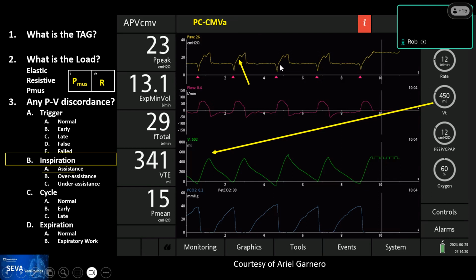So if you have a very short pressure rise, the pressure will rise immediately right up, even if there's an inspiratory effort. So the pressure rise is probably set to make that slow. And why would you do that? For this kind of patient, I probably wouldn't. Then the other thing is we see that once the pressure reaches its target, there's a little dip, and that's probably because that's the peak of the inspiratory effort. But then as the inspiratory effort drops off, the pressure rises again as the PMUS relaxes.